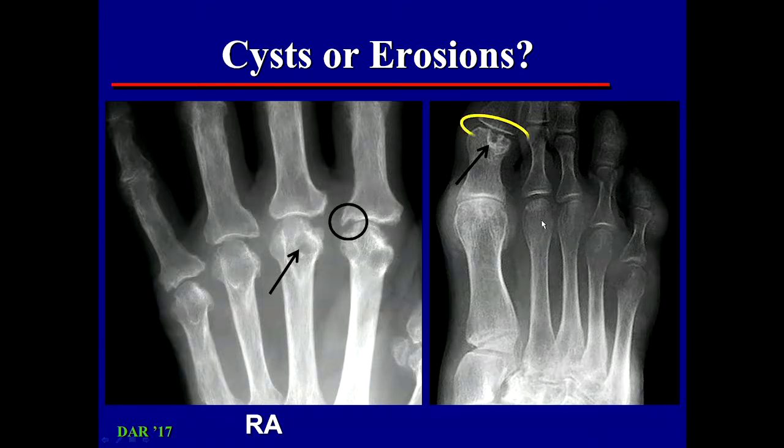What about this patient? Well, here, that joint is perfectly normal. This one is uniformly narrow, but no joints with non-uniform narrowing, no osteophytes. This can't be osteoarthritis either. This patient actually has tophi here, and this is a patient with gout.